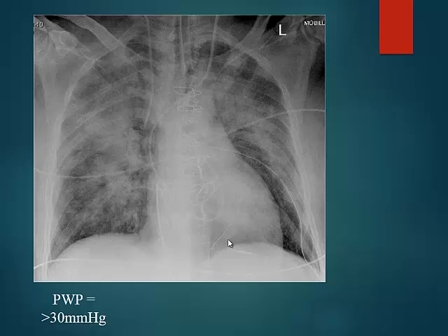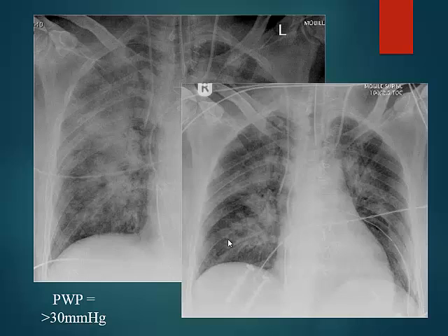The second thing you can do to ascertain this is pulmonary edema, what else can you do? Treat. So you can give diuresis and see a response. Pulmonary edema responds very quickly. Yeah, within a few hours, within the next day, you will see a resolution of pulmonary edema on the chest X-ray.